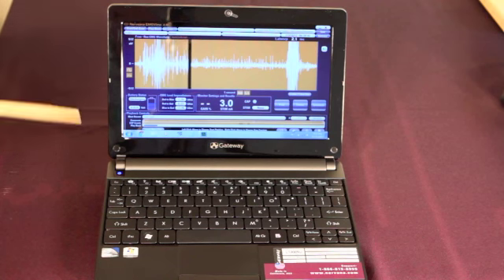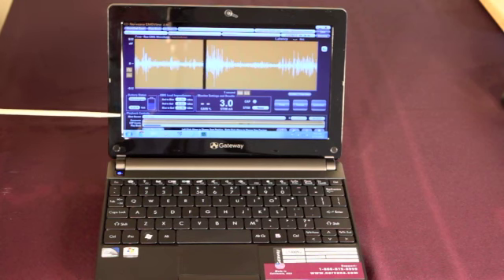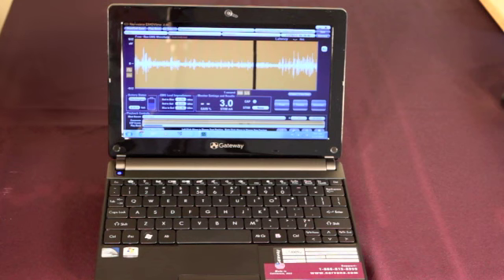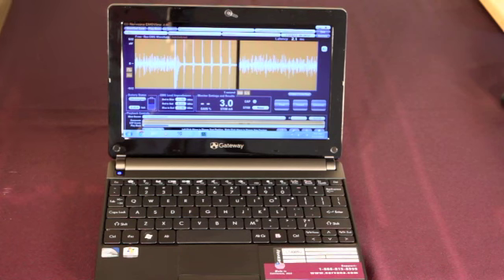Additionally, down in the playback area, you'll note that there are horizontal bars, 4 of them, labeled Most Recent, Comments, Cap Events, and Playback. I'm going to start with the bottom one because that's the most fundamental area of the playback file.